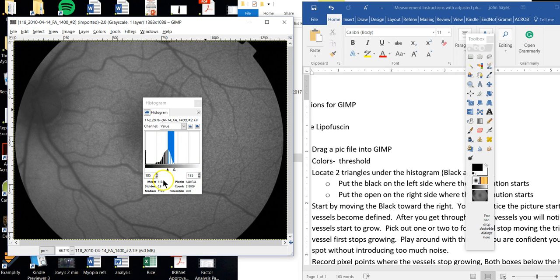And then if you look down here, you can see this is the space that we're measuring. The histogram within this region. This is the white ring that we were looking at. And the mean illumination, the mean pixel, is this pixel right here, and that is 113.9.